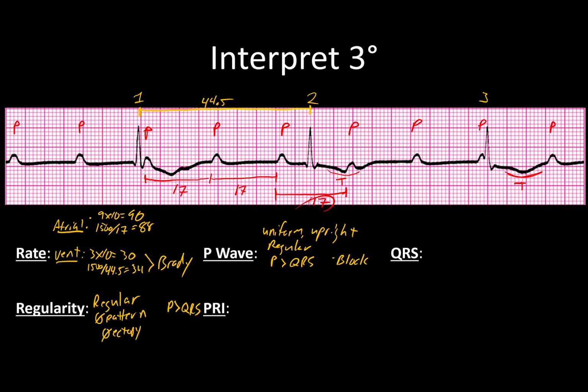In terms of the PRI measurements that we have, this very first one, I kid you not, is 15. My second one right here is 7.